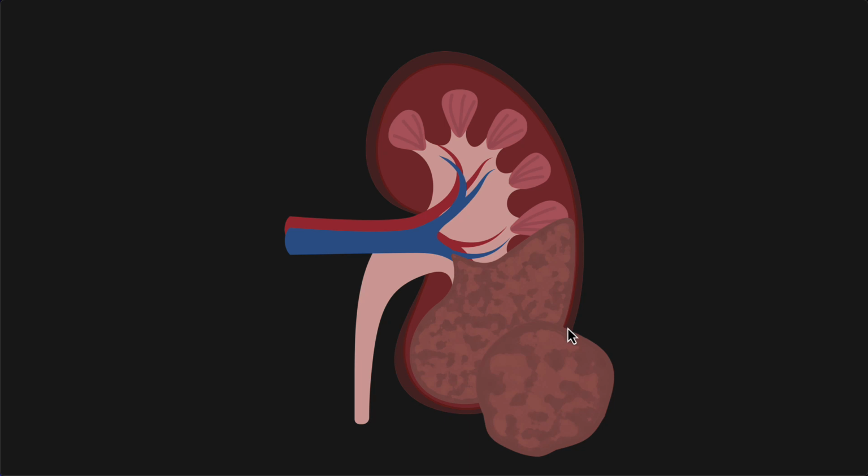Another concept to keep in mind, I'll illustrate this with a couple of the cases later, is that when you're dealing with an infiltrative renal cell carcinoma, a couple of the major features you're going to look for are not only the presence of infiltrative tumor, which can also be seen with urothelial carcinoma, but also you'll usually see a discrete exophytic rounded mass. A major feature of those infiltrative tumors for renal cell carcinoma is tumor thrombus of the renal vein, and that's not a common feature of urothelial carcinoma.